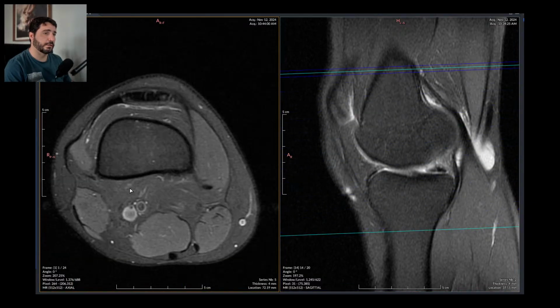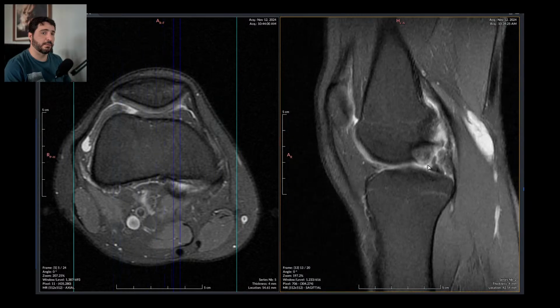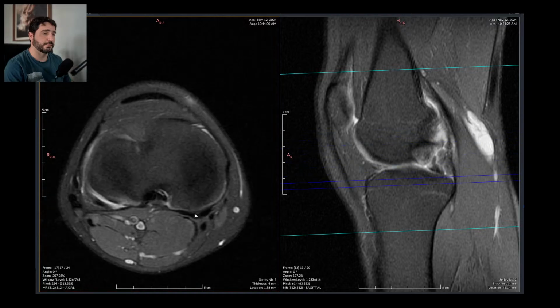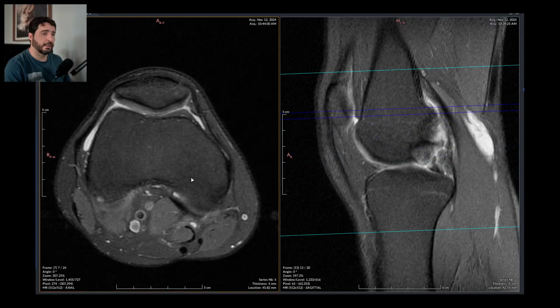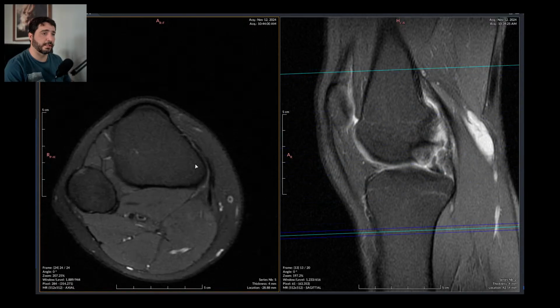This might even be a pre-surgical assessment. They usually treat ruptured anterior cruciate ligaments clinically, and then they do surgery when it's just like this.